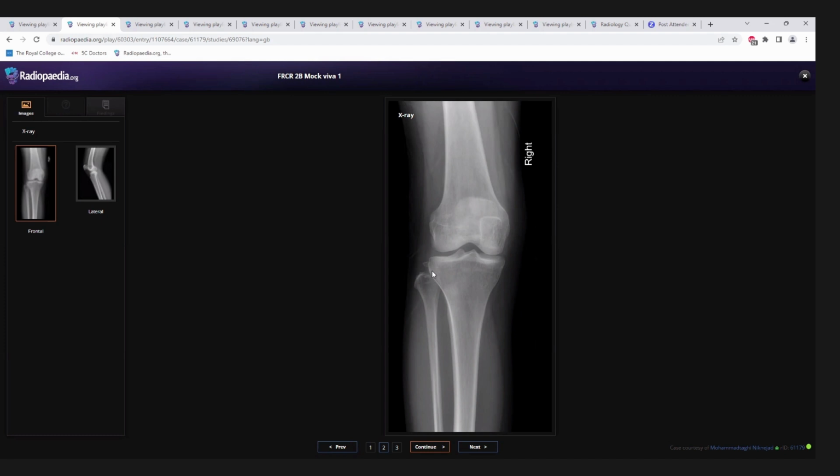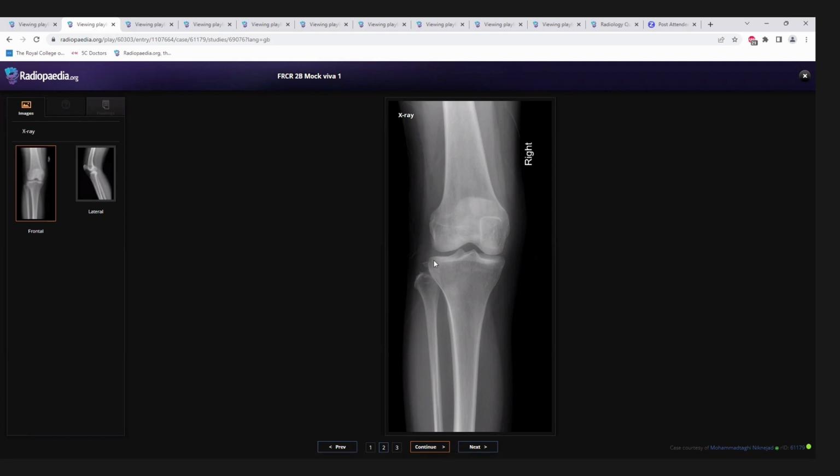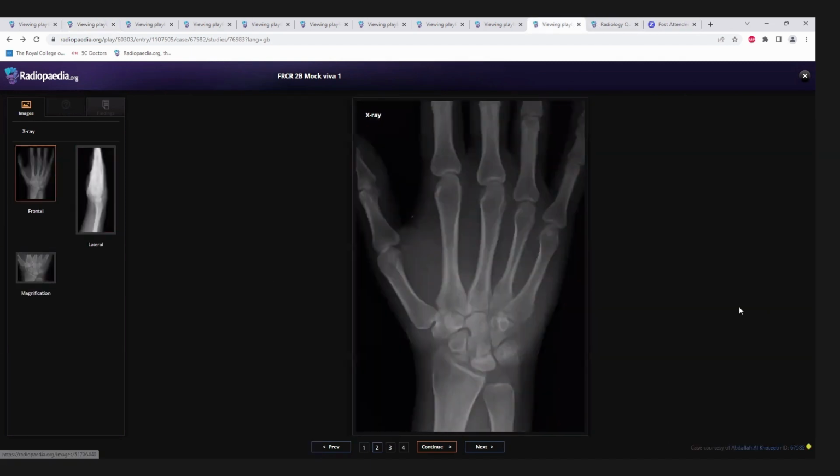Doctor, please check for the fibular head. When you are given this, we have a reflex of calling it Segond, but if you see, there is no cortical break. I just wanted to make the point that this is basically a fibular head fracture, and arcuate ligament injury is what we are concerned about, as well as the cruciates. You said very well that you would recommend an MRI and orthopedician referral, but just don't mix this up with a Segond fracture. This was done well.